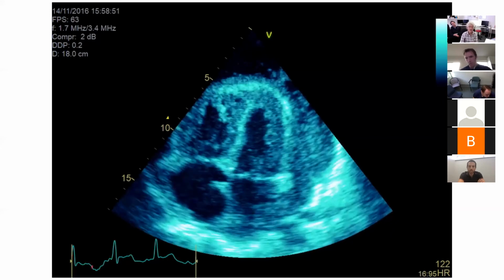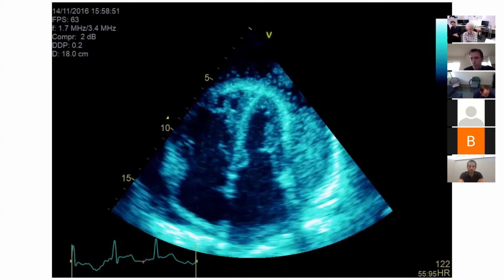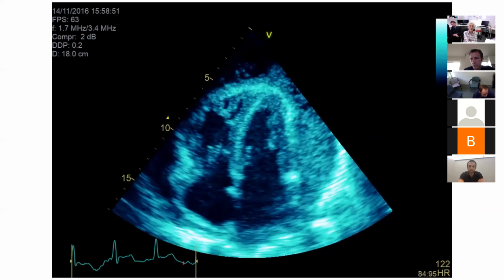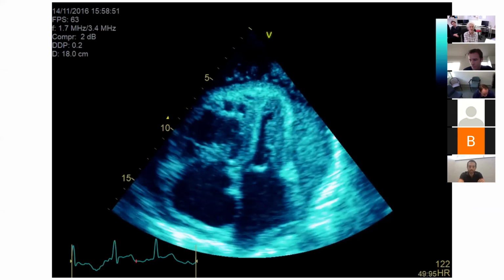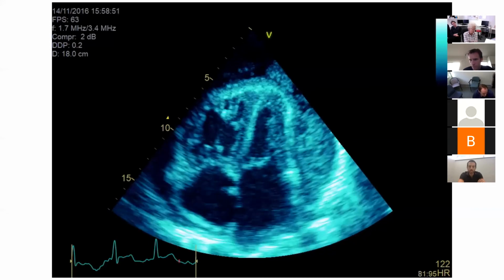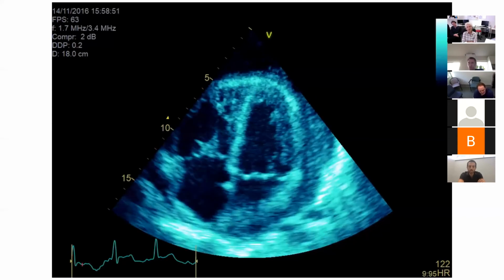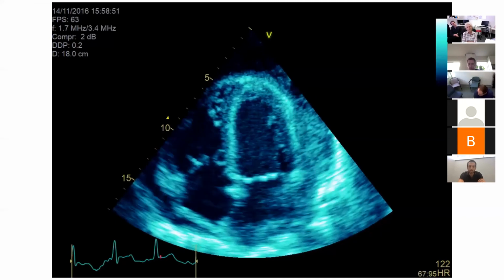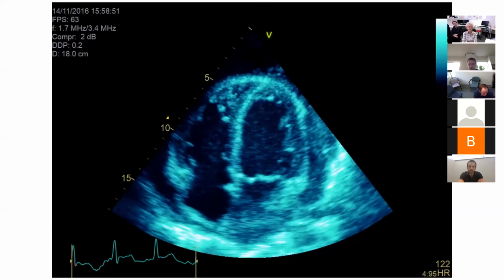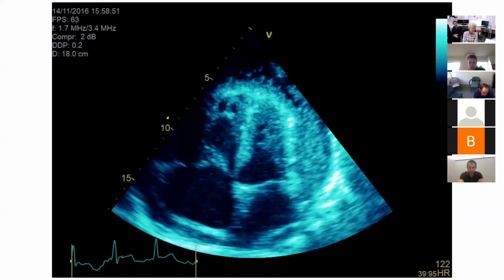Yeah. So in fact, he was drained the next day. It wasn't thought that he had major signs of tamponade, but Lee, I take your point that high right-sided pressures would protect you against collapse, given his previous pulmonary hypertension. He also had some, maybe it's just the image on my screen, but he had some spontaneous echo contrast in the IVC. Yes, he did. So yeah, sluggish flow, shock, that sort of thing. Yeah. Do you agree with that?